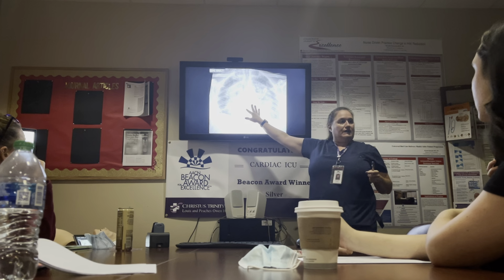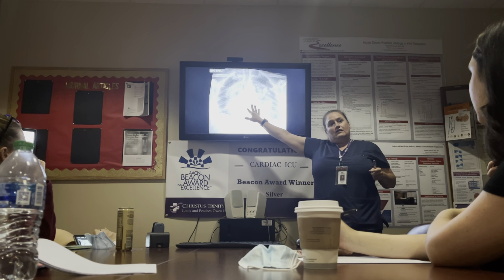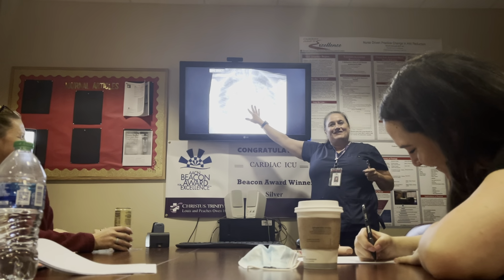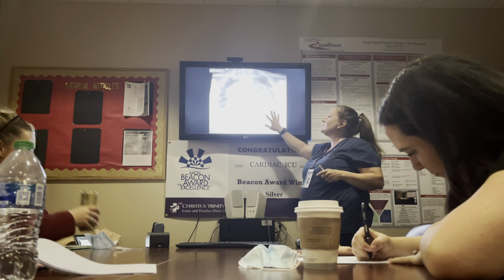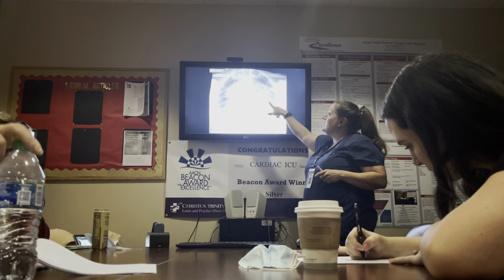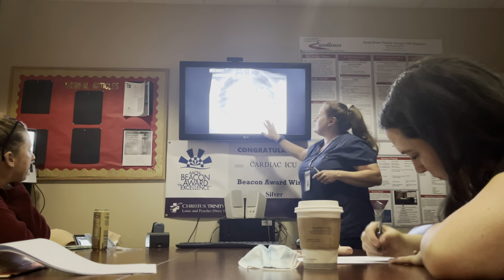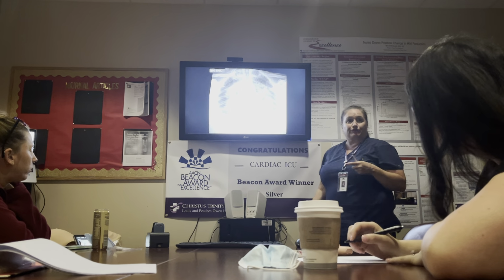I could not find the classic batwing film because it's a film that I have that I have never been able to get copied into a slide, or into a picture. But this is pulmonary edema. So this patient is not intubated, okay? There's not any extra tubes. There's not any real narrowing of his airway there. It's a good expansion film otherwise, it's just that they're full of fluid.